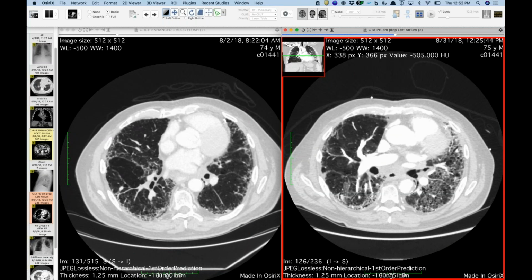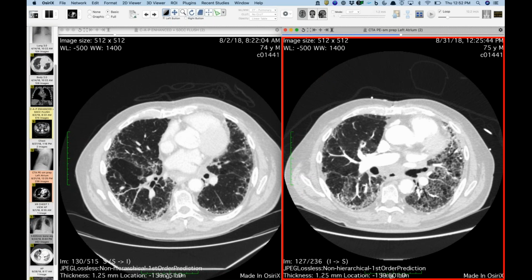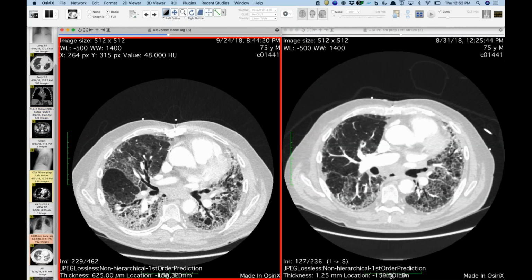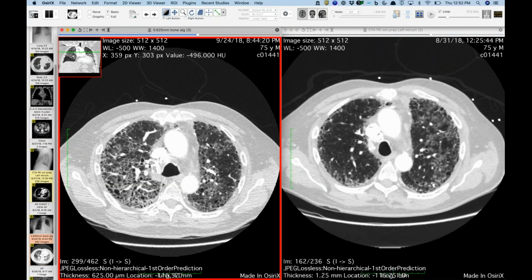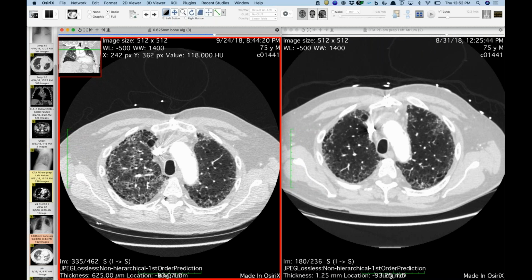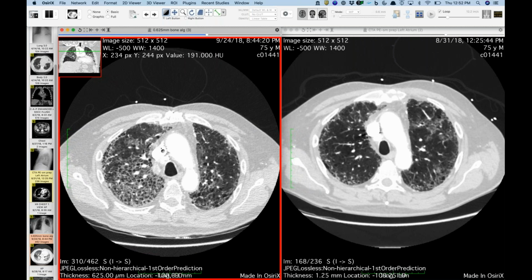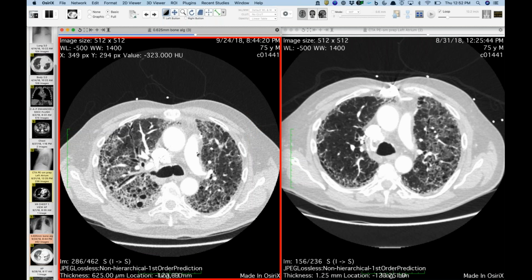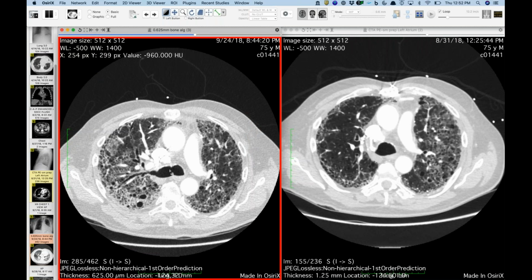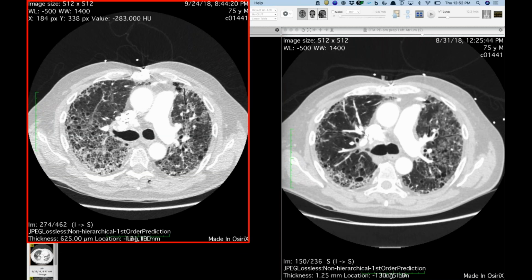And this is not the first case. We've seen a few cases now of radiation, presumably, as the trigger of acute exacerbation. And of course, acute exacerbations have reported close to 50% near-term mortality, despite trying to hit them with steroids and everything else. And you can see a couple weeks later, he was getting progressively worse with ground glass opacities and ended up passing away a couple days after this. I don't think anybody knows all the triggers of acute exacerbation, but this was thought to be due to radiation. I think the time course is reasonable because it was within a couple of months, when you would expect the radiation pneumonitis or lung injury to develop.